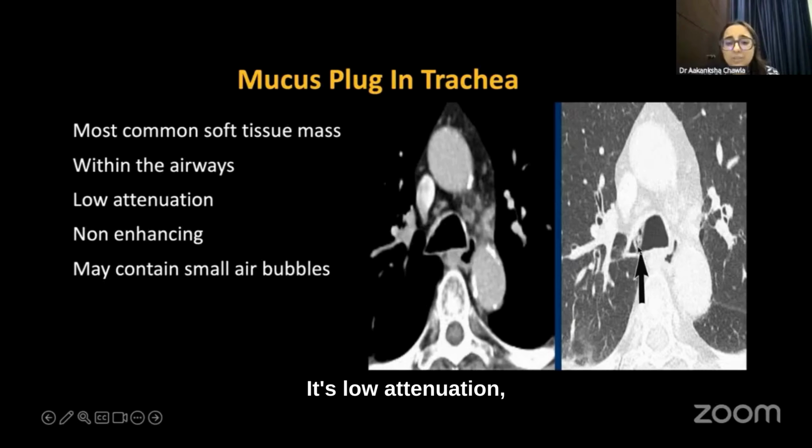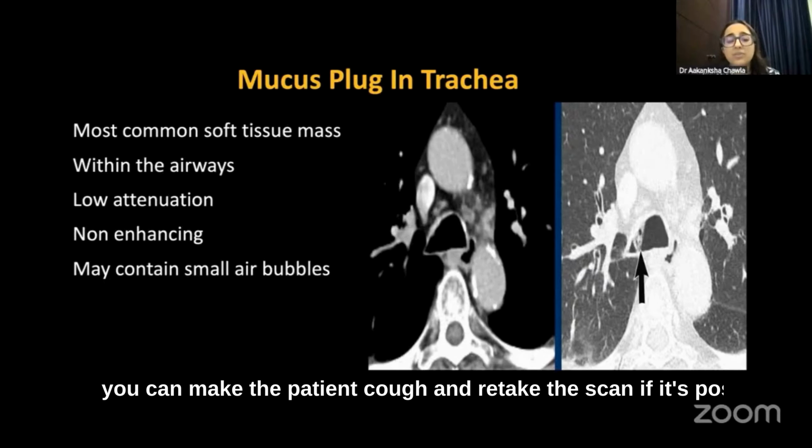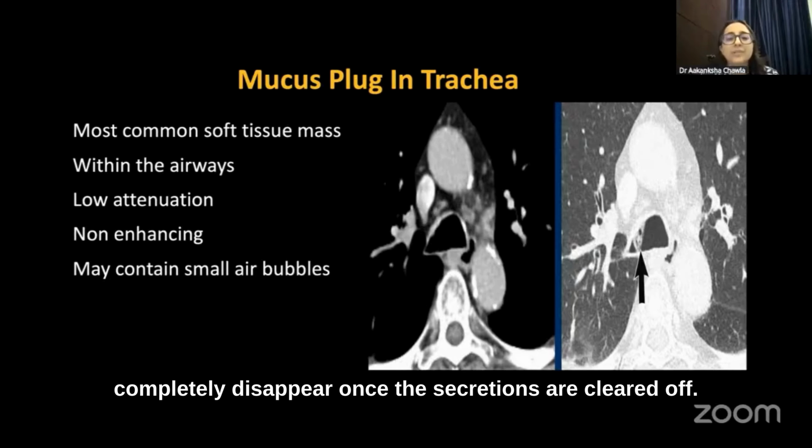It's low attenuation, non-enhancing, and may even contain these air bubbles. So these are characteristic of mucus plugs. Sometimes, when necessary, you can make the patient cough and retake the scan if it's possible, and this might completely disappear once the secretions are cleared off.